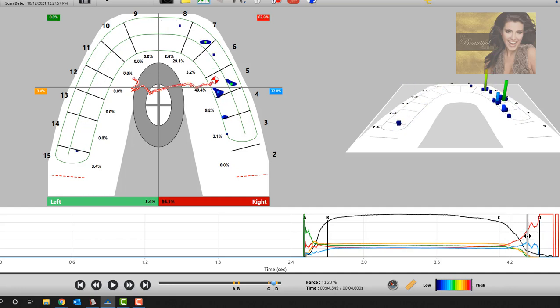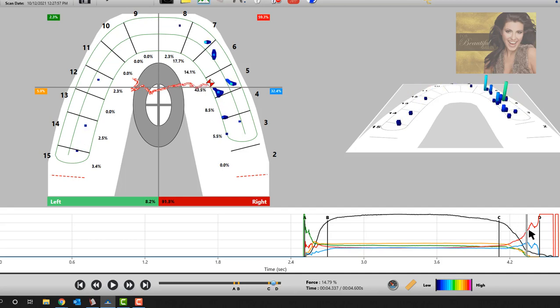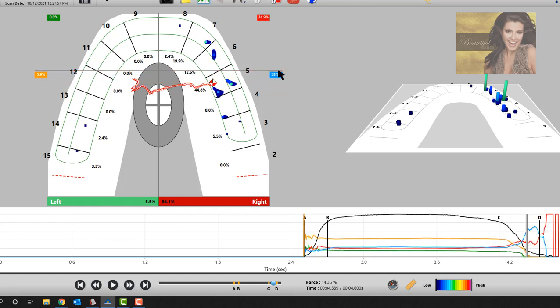And it's true that the anterior is kind of taking control over bite force, but what happens is this tooth, tooth number 5, belongs in the posterior quadrant, which is blue, not in the anterior quadrant, which is red. And so you have to take this little line. Now watch what happens down here again. I'm going to take this line and correct this to be about right there.